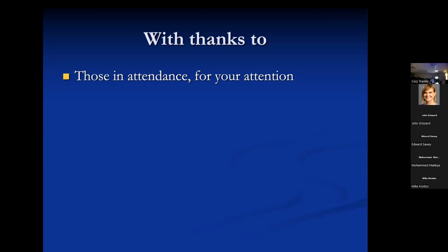And then lastly, if all else fails, try a single shot or real-time imaging, where you're not doing segmented imaging or building it up out of multiple beats. You're just imaging it in real time, okay? Thank you very much. Sure.